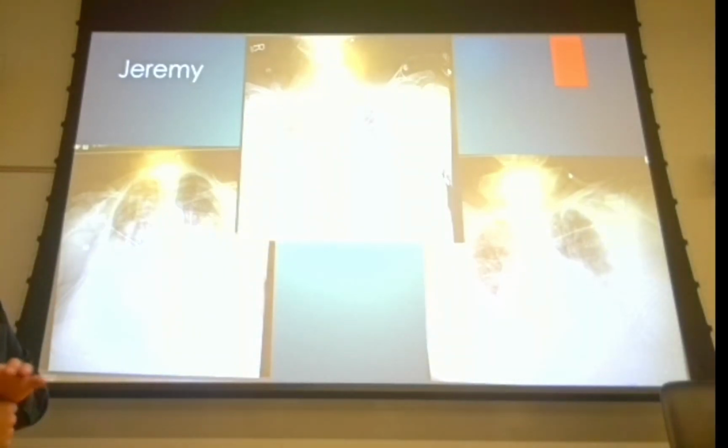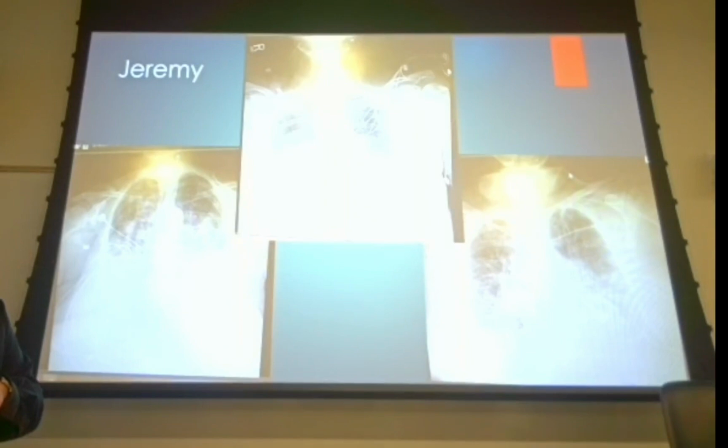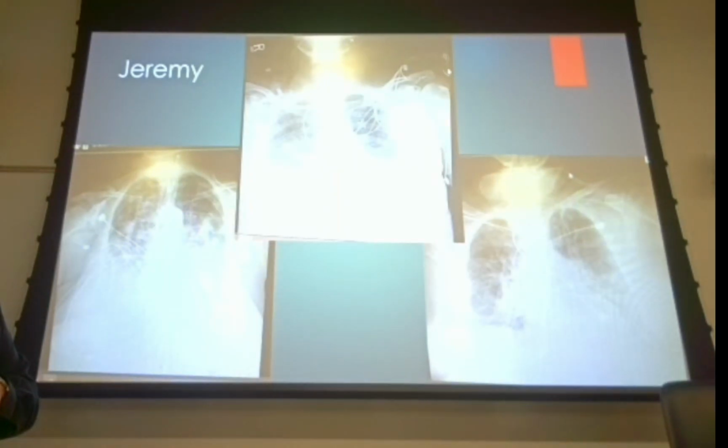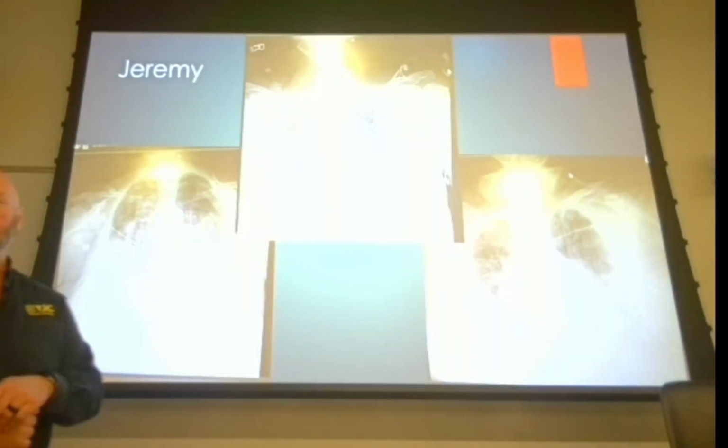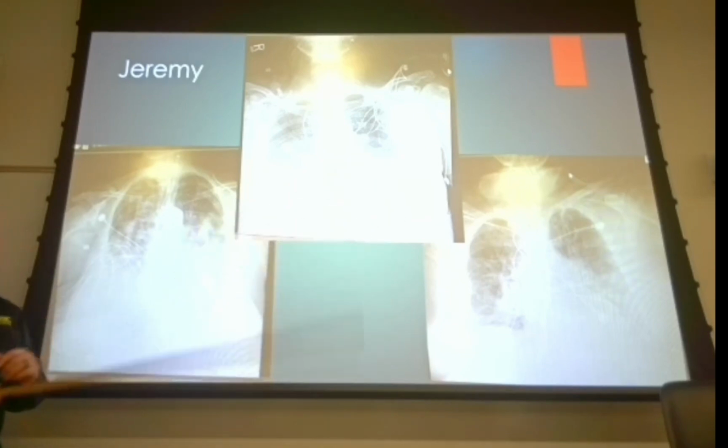What's your definitive exam for pleural effusion? I think you said it. Somebody said it. Decubitus. Yeah, decubitus. So in that case, we definitely need a right lateral, possibly a left lateral. The patient's heart looks massive anyway, which very well could be causing the appearance. So there may not be an effusion over there. It just may be the patient's heart displacing all that lung.